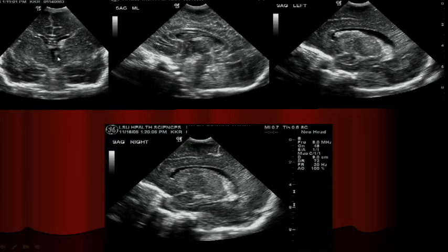Here is a head ultrasound. This is the coronal. This is the sagittal. Here we have the nice. What's this little piece of the corpus callosum called? Rostrum. They can ask you that on your boards in normal anatomy. Here's the genu, the body, the splenium. What is this? Which part? Vermis of the cerebellum. This is midline.